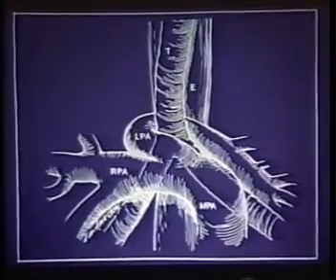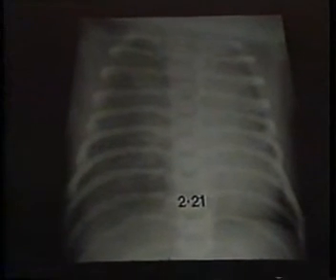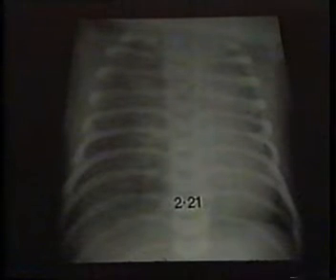This is an angiogram in a sitting up projection showing the origin of the left pulmonary from the right as it passes around the tracheobronchial tree to enter the left hilum. Patients typically present in the manner that Eric described.